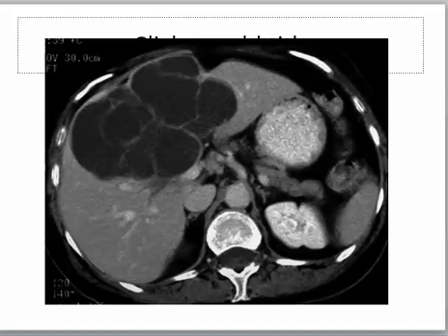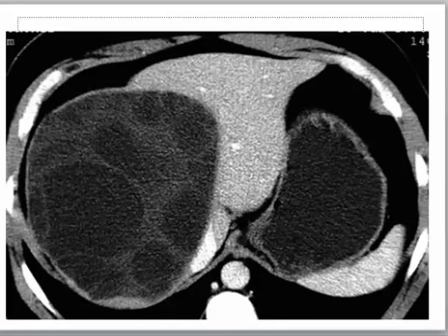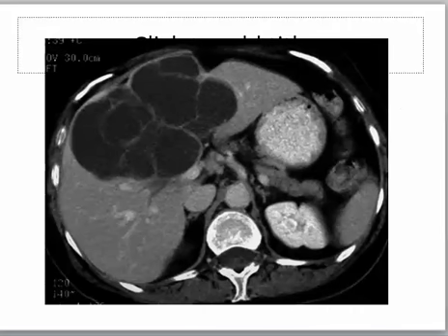Biliary cystadenoma is similar to hydatid disease, but all are within the liver. This is number one, and number two, it presents a bossy outline. If you compare this one with this one, this is the hydatid disease, where all are enclosed in one smooth curved outline, while here it is of bossy outline. So biliary cystadenoma is another possibility of septated liver cysts showing bossy outline.